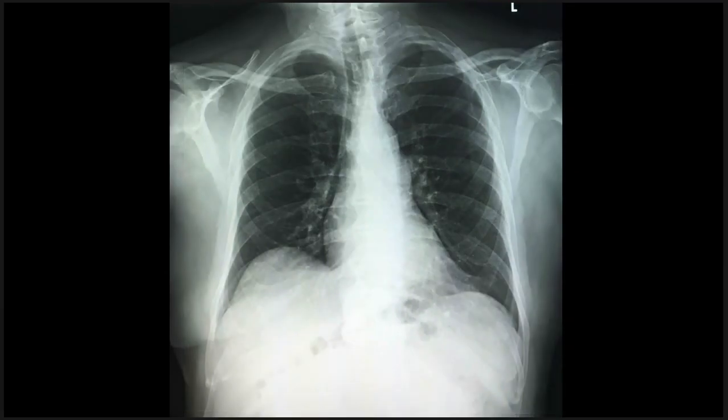Show another case. This is a different patient, something similar looking. This time on both sides of the heart. I'll tell you that this patient also has no symptoms. It's sort of strange, but sure enough, there's a black outline around the heart. What do we do with that? So this is actually an optical illusion.